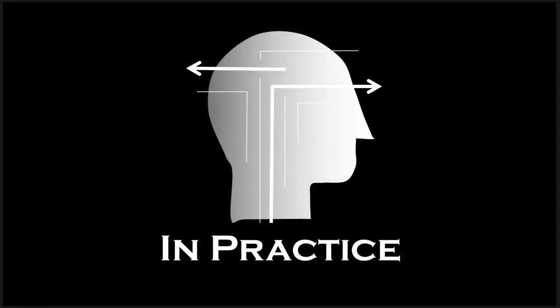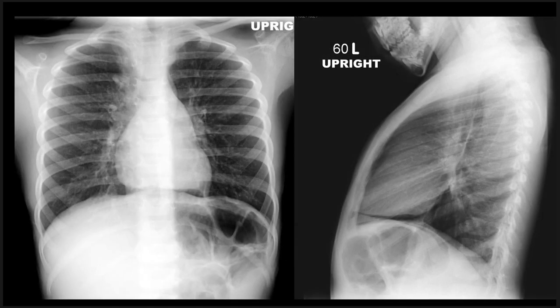Play a little bit more here. This time we're in the ER and we have a bulimic teenager who now has chest pain after an episode of vomiting. So I'm going to highlight the abnormality here, both on the frontal and the lateral view, and then we'll talk about why it looks like this. So here and here.